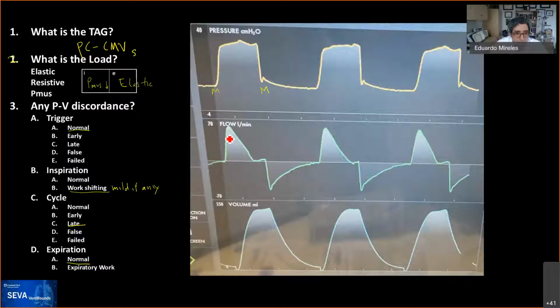So you have a rapid rise on the flow, and then you would expect an exponential decay on the flow, and instead of that, you see that it's more straight. Here you kind of see that curvature that you're expecting, a little bit higher, and that makes you think, is the patient doing PMUS? Because normally anything that moves up signifies that there is some patient effort. Otherwise, it should decline nicely. Is there any other reason that can give you this hump in a patient that was paralyzed?